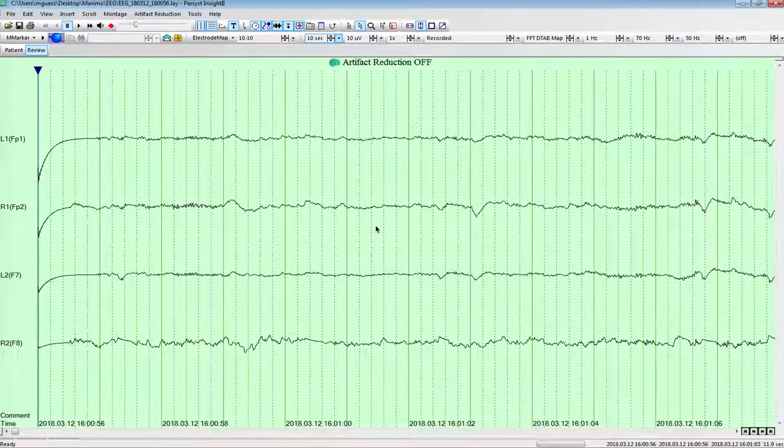Hi, this is Michael Guest from Persist, and this is an ad hoc screencast on how to calculate delta power and peak frequency and some other metrics on a 4-channel EEG. And to do that, we're going to set up some initial parameters.